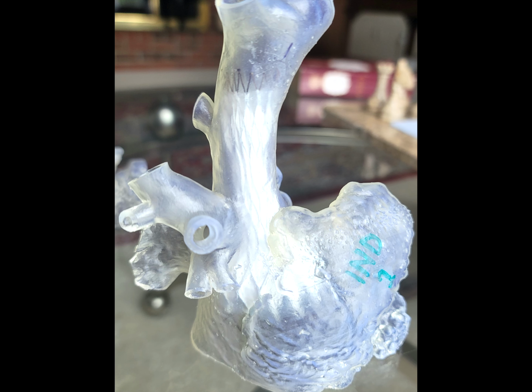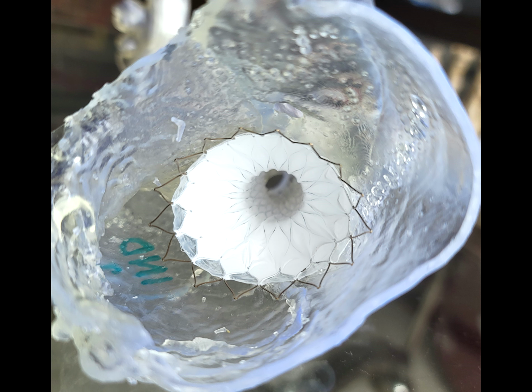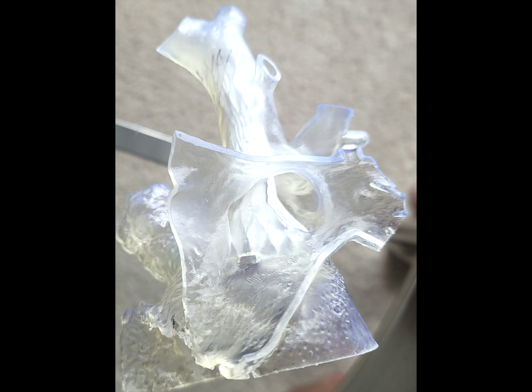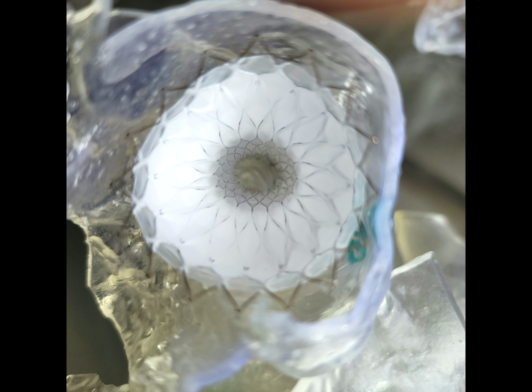Virtual 3D models help to define the variation in pulmonary venous drainage, and implantation of the device in 3D printed models further enhances the device development. This illustration of VB stent in 3D printed models highlights the utility of 3D printed models in device development for congenital heart defects without the need for animal experiments.